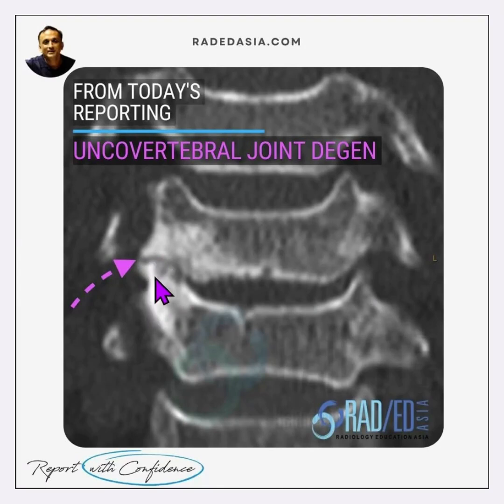We don't have the lateral on this view, but if we saw the lateral, there are likely to be osteophytes arising from here and extending into the intervertebral foramen. So the importance of seeing the degeneration here is twofold. One is that there can be osteophytes extending from that degeneration into the foramen with nerve root compression. Secondly, this can be a pain generator on its own because there's significant degeneration here at that joint space.